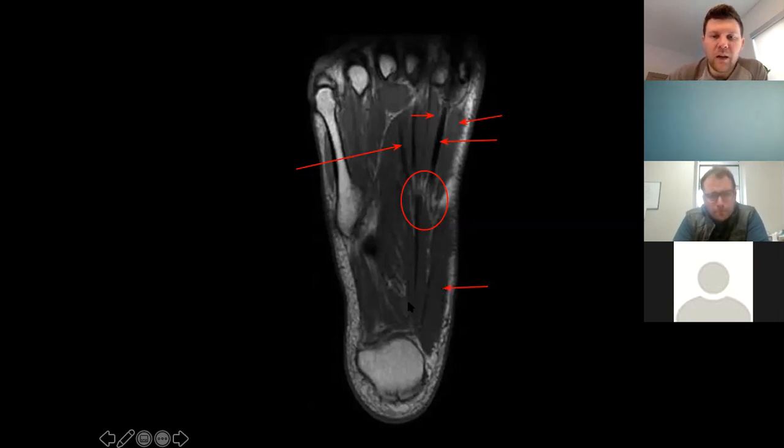Okay. And if there's a muscle that we talked about that's kind of deep right in here that should be inserting on your FDL tendons, what would that one be? Your quadratus plantae. Okay. And then it's hard to tell fiber-wise if we have any of the flexor digitorum brevis tendons or muscles, but we know that we're deep to that, right? So we probably shouldn't see anything because we're already seeing what layer is all of this going on in? Your second layer. Good answer.